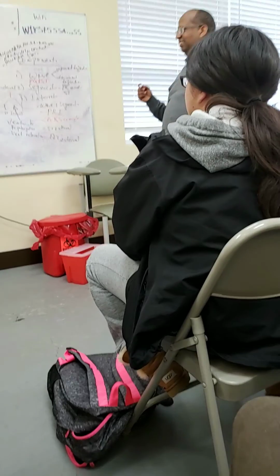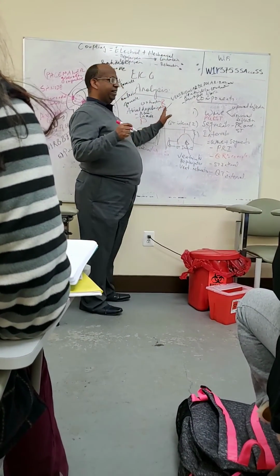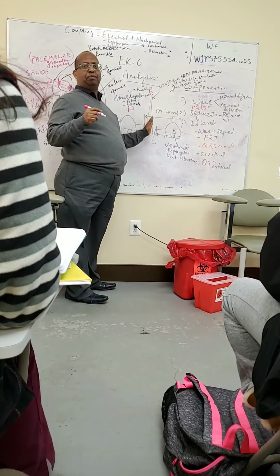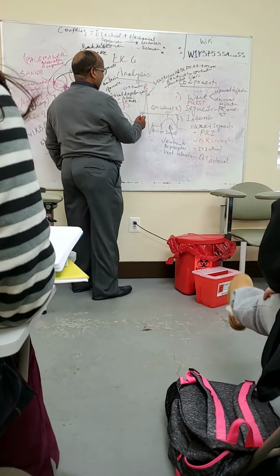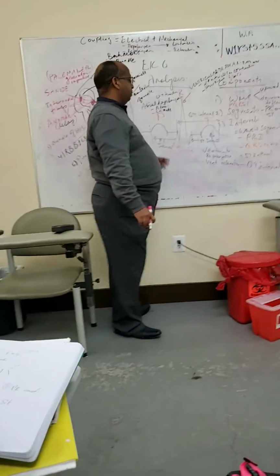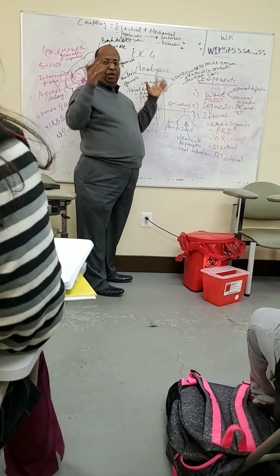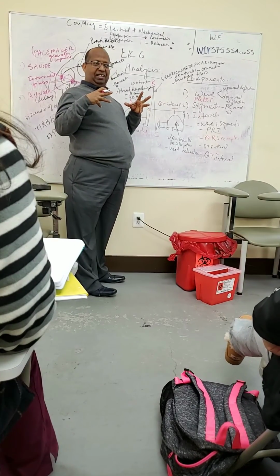Relaxing? Okay, the thing is, because there is QRS here, this tall guy, he covers that wave. So that wave doesn't appear here. But the atrial repolarization already happened here, together with QRS. When QRS contracts, the atria already relax.